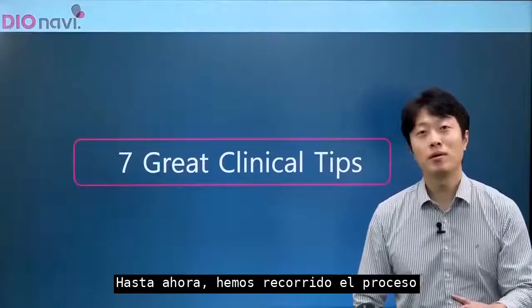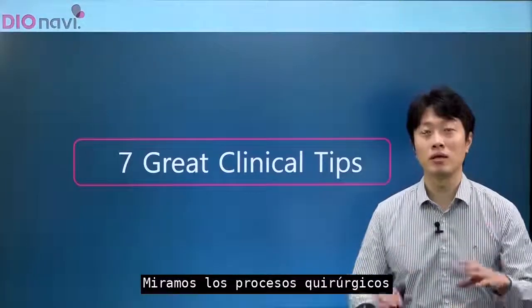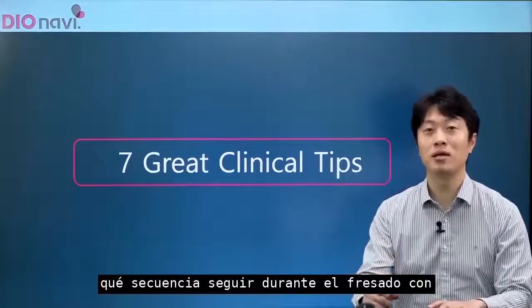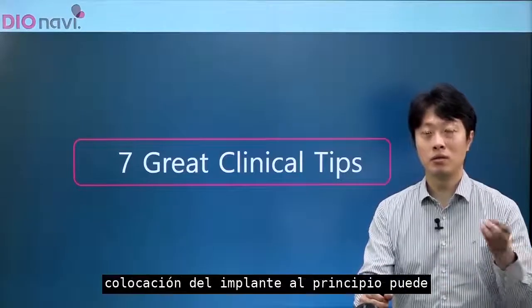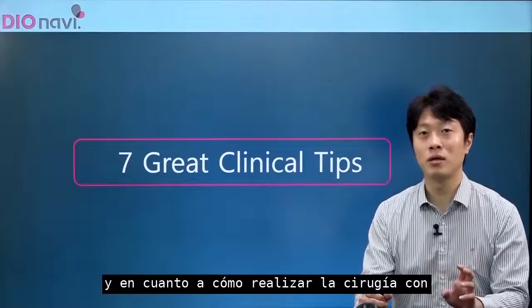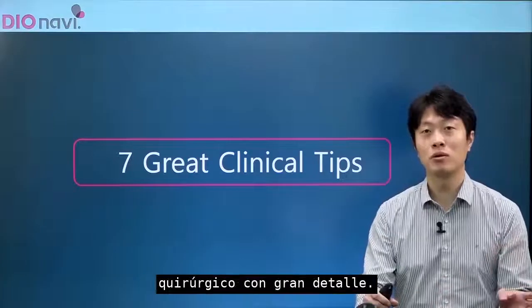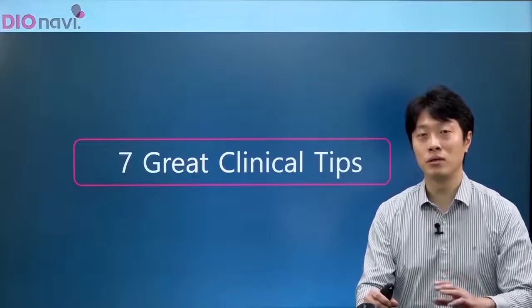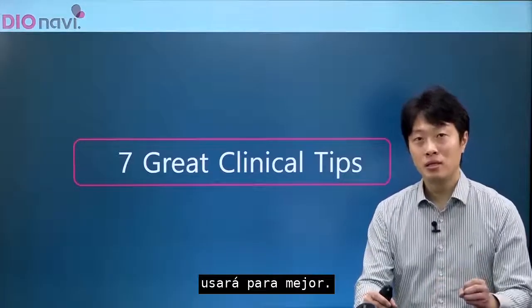We have thus far walked through the basic implant placement process. So far, we looked at surgical processes, including what the kit is made up of, what sequence to follow during drilling using the kit, and what sequence to follow during implant placement. At first, you may feel a little awkward with the drill and as to how to perform surgery with it. Since it is featured in the surgical protocol in great detail, you can follow the sequence and perform a few surgeries. After a couple of rounds, you will get used to the surgery method and use it for the better.